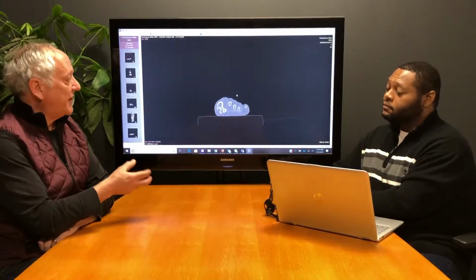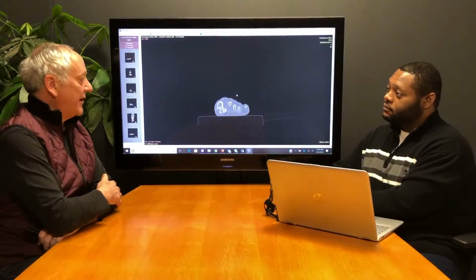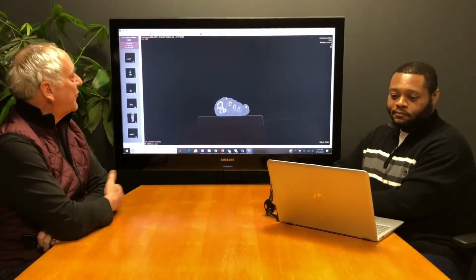So in order to construct a 3D model from a series, we have to first upload that series into our PAC server in the cloud, correct? Yes. Terrific. Let's go ahead and walk through that.